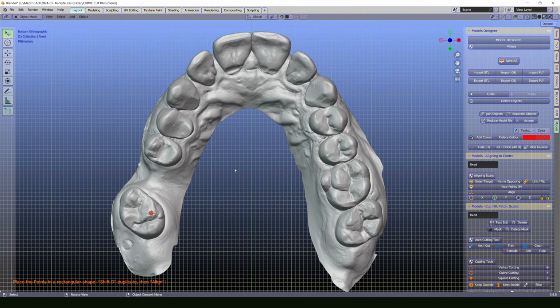And now we have 3 points left to have the 4th of them. I push shift on a keyboard and the right mouse button on a canine to move the target, and push again 4 points. And again, I push the shift on a keyboard and right mouse button on another canine.